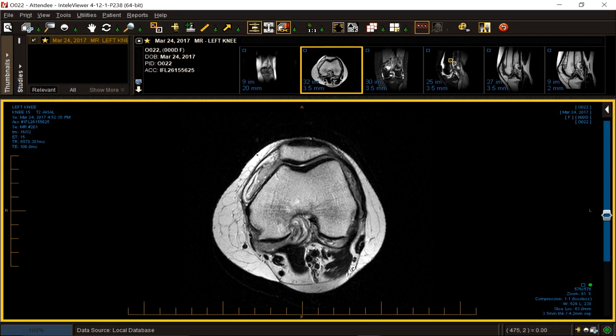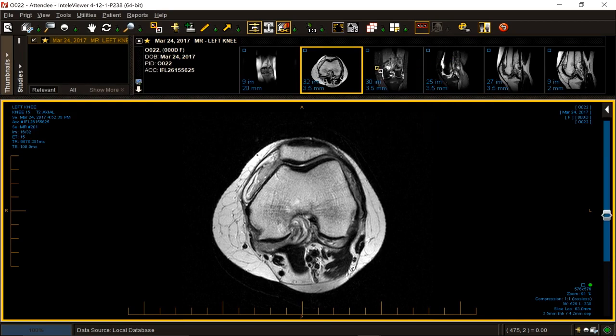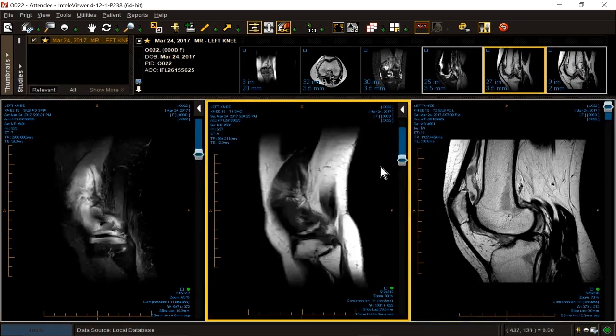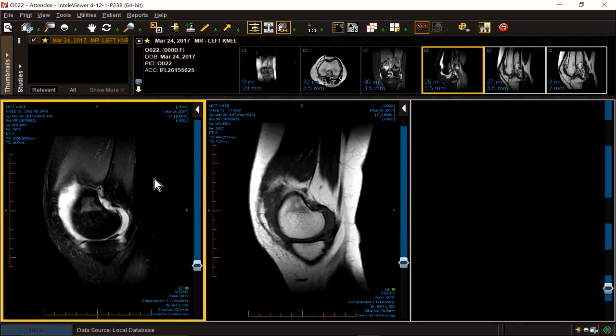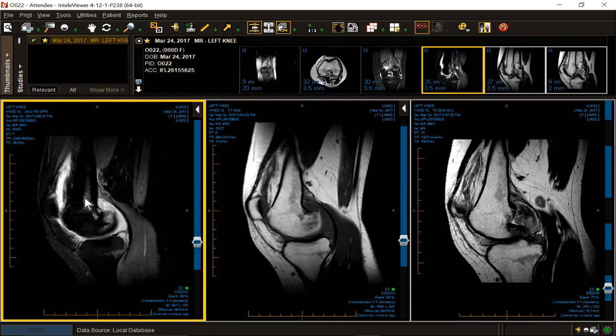Let's keep looking, shall we? What else might we like to see in this patient who is presumed to have a mechanical internal derangement? Let's go sagittal since we have more of them. And we are fast, expedient, we're efficient. We're rolling, we're scrolling. Scroll them all at the same time. What do we want to see in somebody that has an inflammatory, autodigestive, proteolytic enzyme-producing arthritis? We want to see a floppy joint, elasticity of the joint with an effusion.